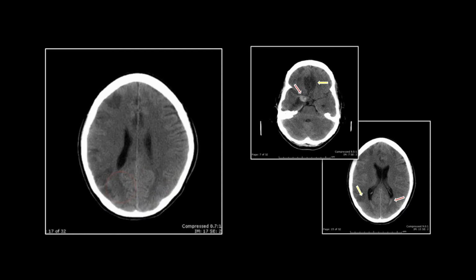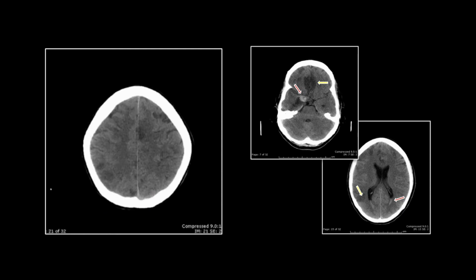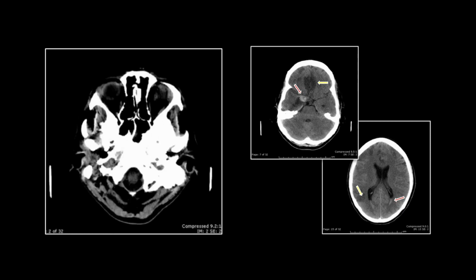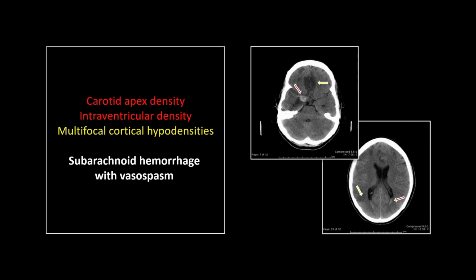This patient walked out of the hospital no more than a week later, and on the follow-up scan just about 3 days later, it was so normal that I didn't bother saving it, which is pretty impressive. So incredible to believe that that could have resolved and this patient really survived very well, but that was in fact the case.